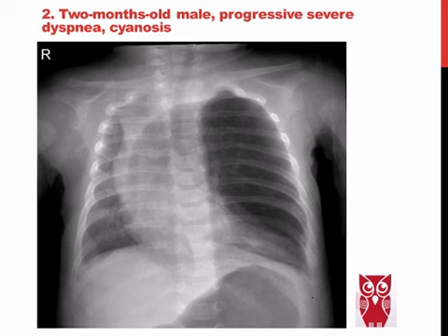Moving further to the thoracic area, this is a typical X-ray of a typical situation, and if you've seen it once, you know the diagnosis. If you don't, you need to work through this. This is mediastinal shift, this is compression atelectasis of the left lower lobe, overexpansion of the left upper lobe extending to the right of the midline.